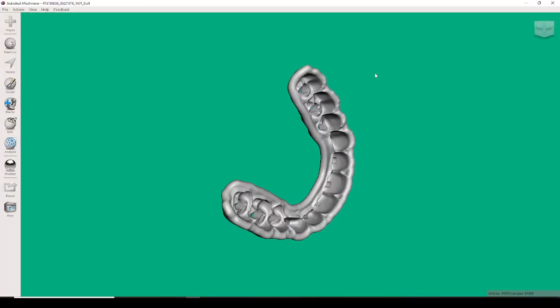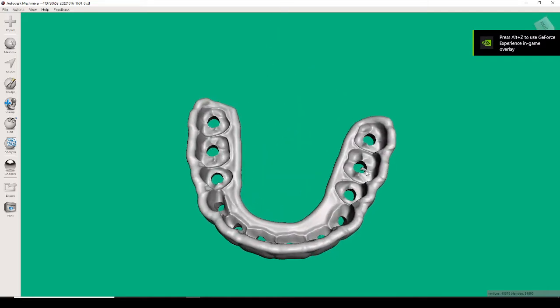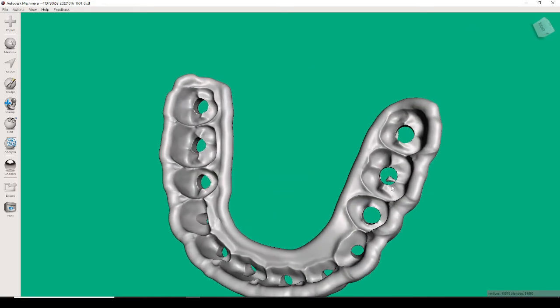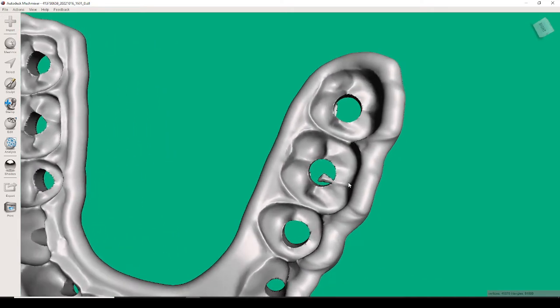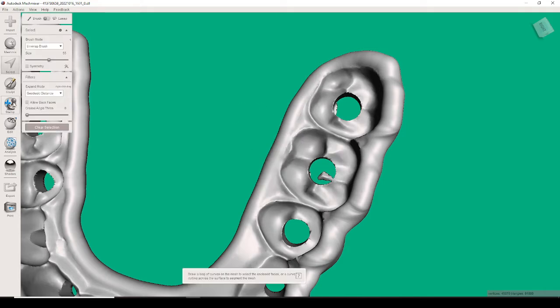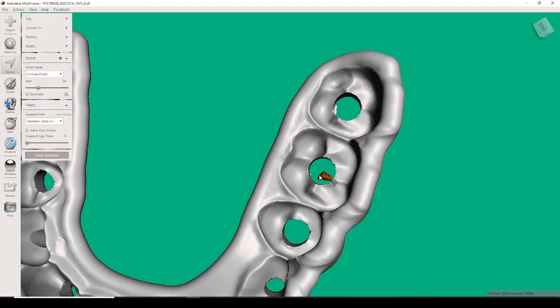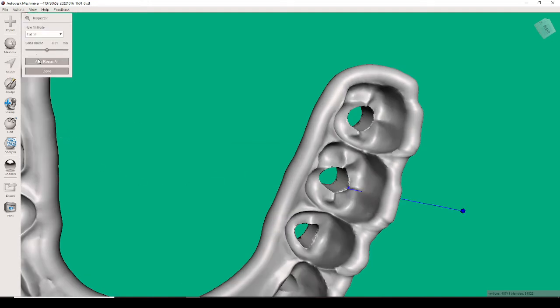Okay, and we're actually going to also bring in, oh, we got a little bit of a piece that didn't work out here for some reason. It's actually in our way, but there's an easy way to clean that up. So we're going to go into select, make it a little bit smaller, and we're going to just highlight that particular area right here. Okay, and we're going to delete it. And then we're going to clear selection, press I, and just auto repair all.